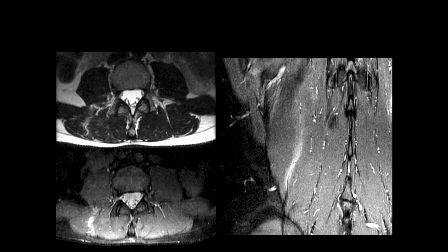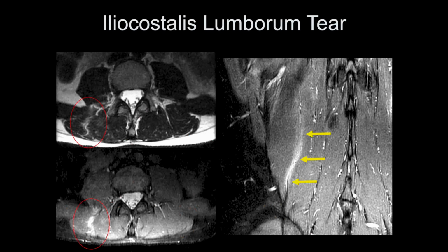So we end up with a multifidus tear. All right, Robert, what do you think of this case? Okay, here I see some edema within the right paraspinal musculature. I'm not entirely sure what the muscle is, but I'd be concerned for a strain there.